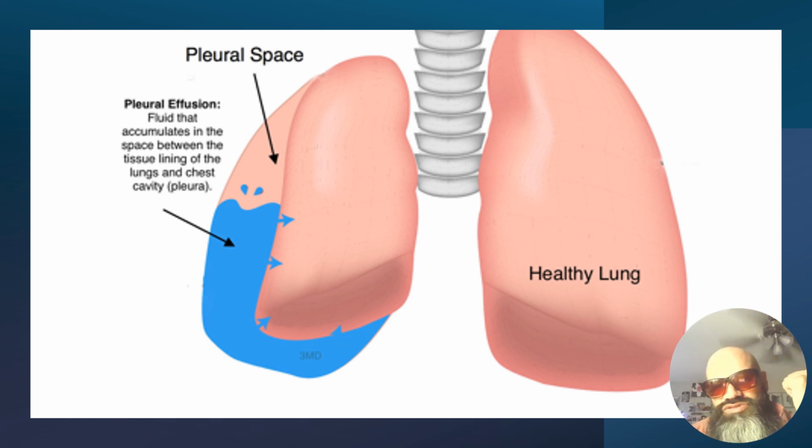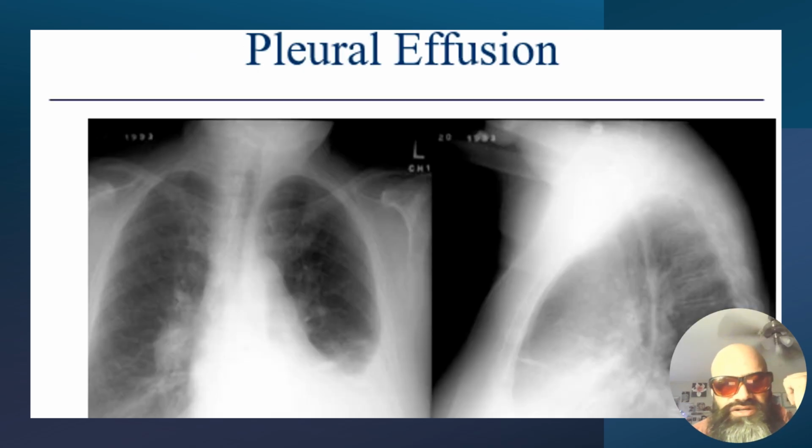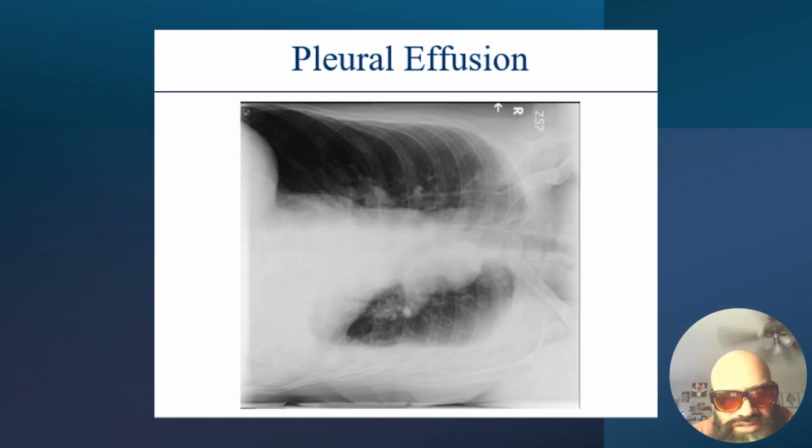Okay, so when you start seeing pleural space occupying lesions such as high fluid density as seen here, you're going to consistently have findings that are focused on pleural effusion. So here is one as well, another pleural effusion. You can see here in the lateral decubitus view, the fluid encompasses this entire lung field here with this air fluid line.